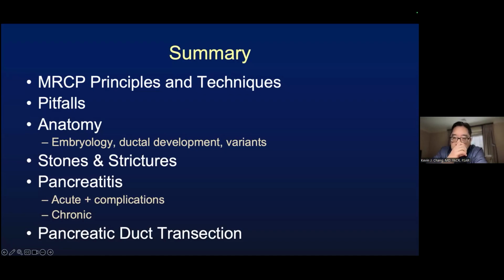So the next question is, what do you do when you find pancreatic calculi in the pancreatic head and a dilated pancreatic duct, but you don't see a tumor or a mass in a patient who never had pancreatitis? If I'm reading that correctly, a pancreatic calculus is not a typical feature for a pancreatic mass. So if I see a pancreatic ductal calculus, I will definitely mention it, especially if there's an upstream dilated duct.